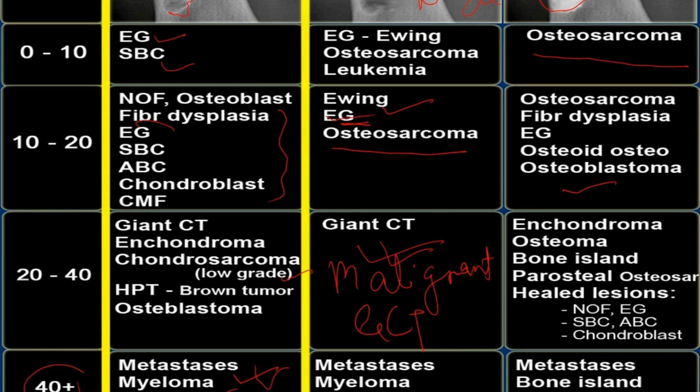So degenerative lesion can show the well-defined margin, whereas the ill-defined margin can be seen in metastasis and myeloma. So ill-defined margin is more common in metastasis and myeloma, and sometimes it can show the well-defined margin. This belongs to both well-defined and ill-defined margins.